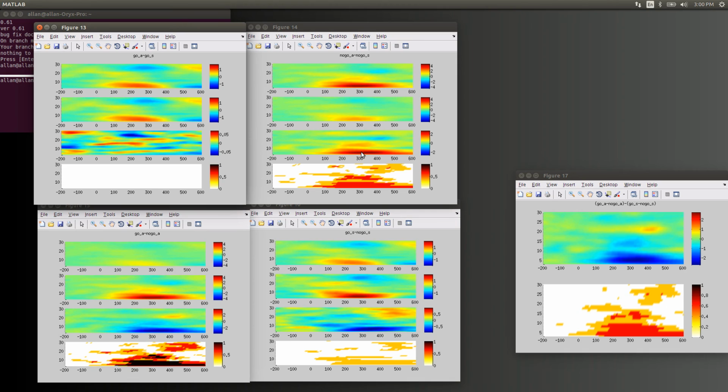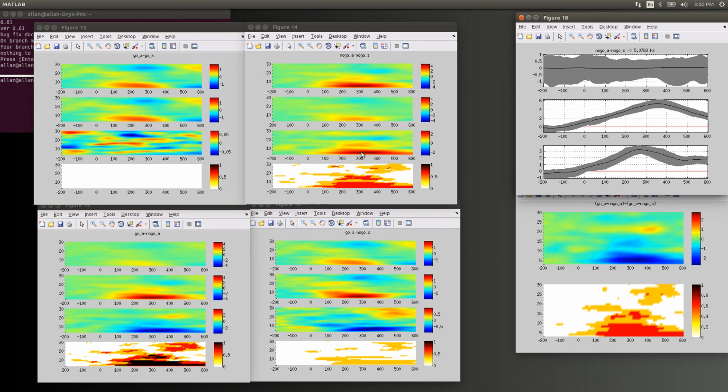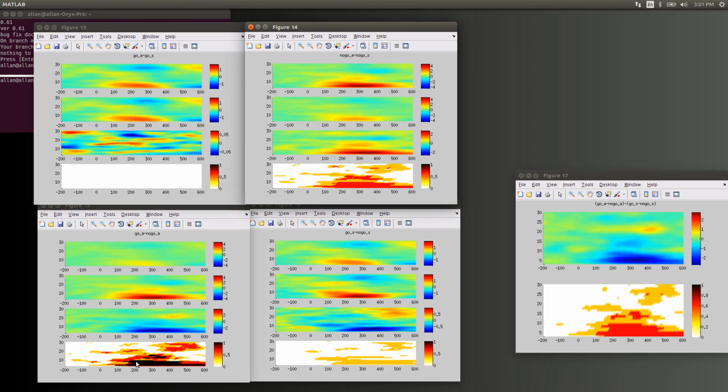And of course, again, the little Easter egg is if you click on the difference waves, now you can actually verify that. So I'm clicking here at about 5 Hertz, and indeed you can see that 2 out of the 3 subjects had a significant difference at that frequency across time. Okay, so that's pretty cool. And there's an effect here that seems to be shared by all 3 subjects.